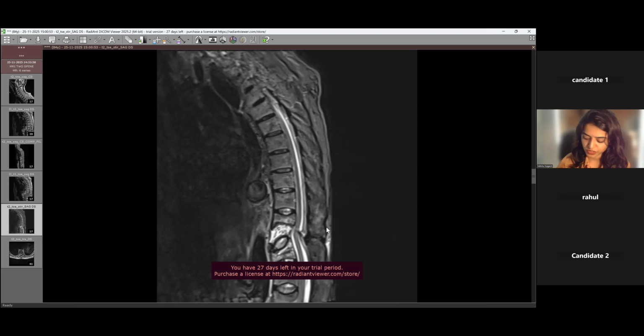And how would you differentiate this from, say, ankylosing spondylitis? Yeah, in ankylosing spondylitis, the anterior syndesmophytes would be slightly thinner, along the annulus fibrosus, and in DISH they will be more confluent.